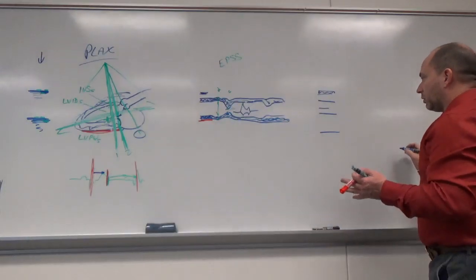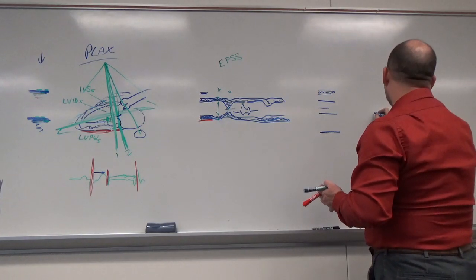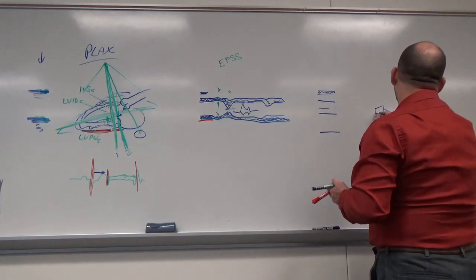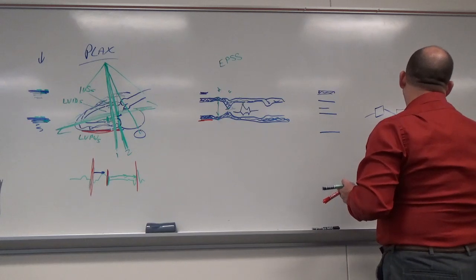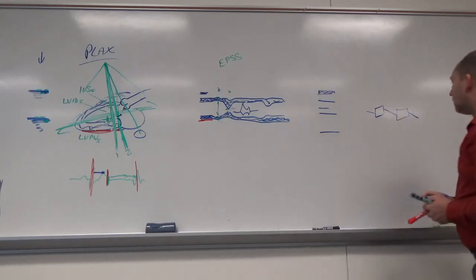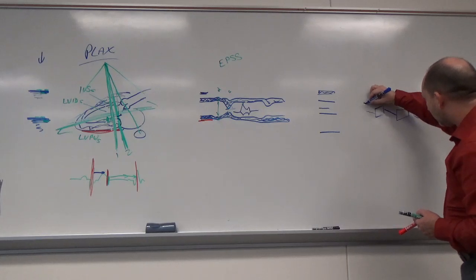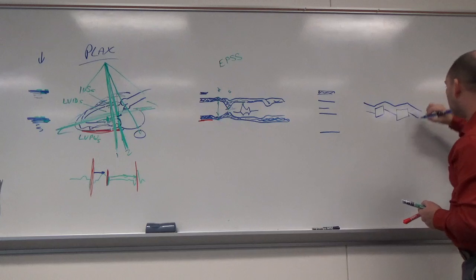So timing-wise, what are we looking at? Usually we get some up and down motion. I'm going to draw the boxes and stuff in here because it's easier for me to do it. Oops, this should be going up. And then my aortic root, this wall is going to be coming down. It goes up, and then down, and then up, and then down.